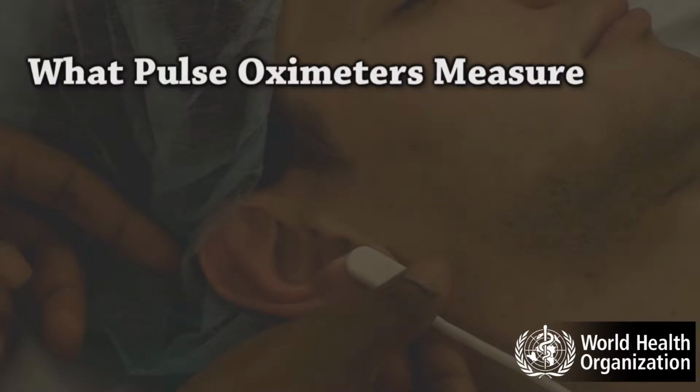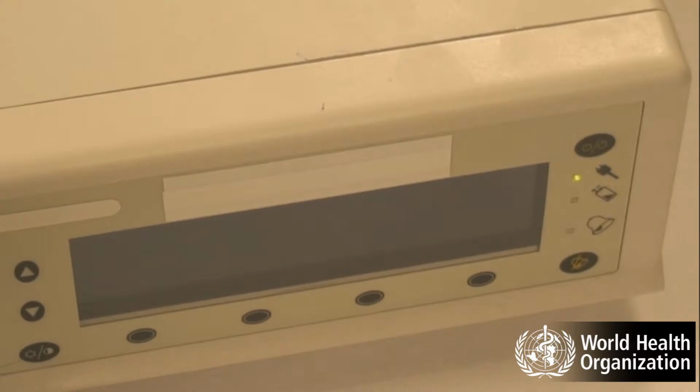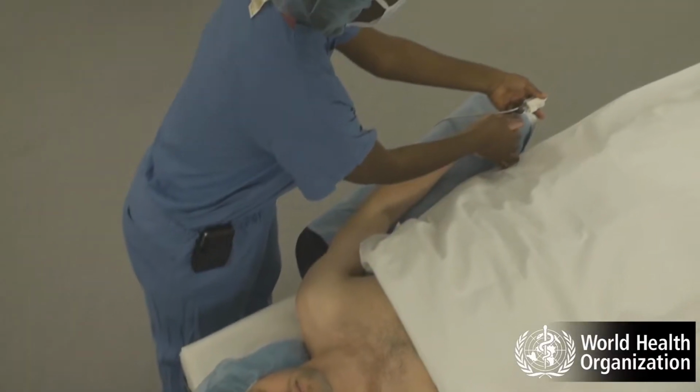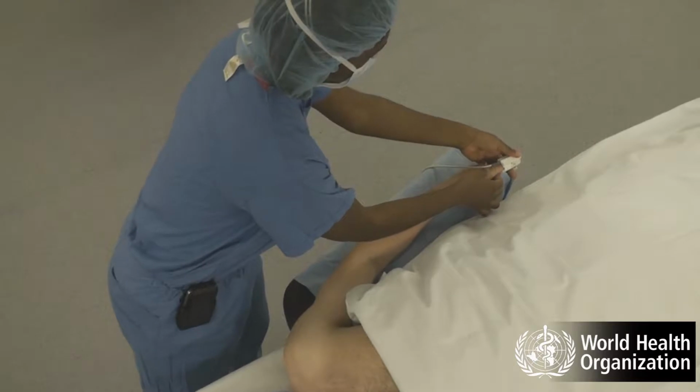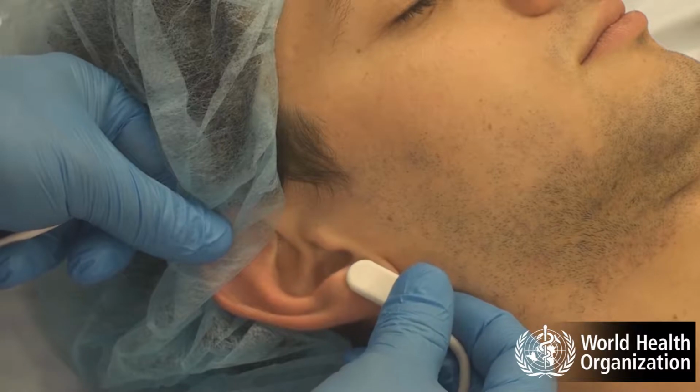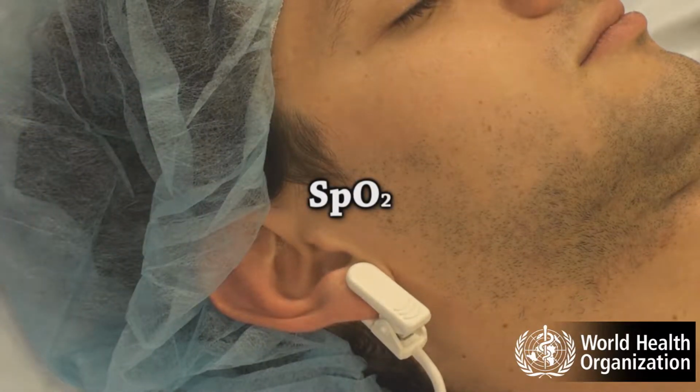What does a pulse oximeter measure? The pulse oximeter measures 2 numerical values: the oxygen saturation of hemoglobin in arterial blood and the pulse rate. The value of the oxygen saturation is given together with an audible signal that varies in pitch depending on the oxygen saturation. A falling pitch indicates falling oxygen saturation. Since the oximeter detects the saturation peripherally on a finger, toe, or ear, the result is recorded as the peripheral oxygen saturation, described as SpO2.